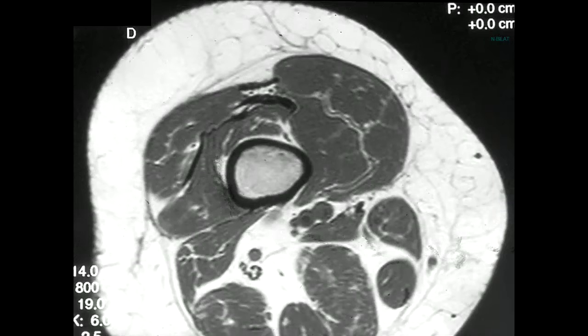It is also important to get involved with the imaging as it is being done. And certainly for tumor cases, I like to be available to answer questions that the technologists may have, and I also like to check them as they're being done. This was a patient who came in with a soft tissue swelling about the knee without a specific area of involvement. So we did the image of the knee on a relatively large field of view, and I've collimated off the back so you can look at the detail of the more anterior portion.